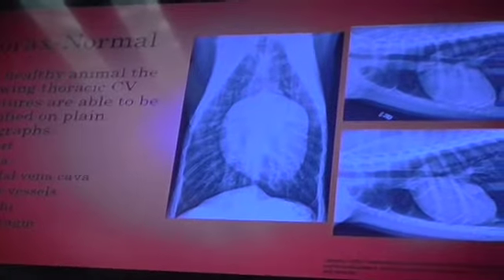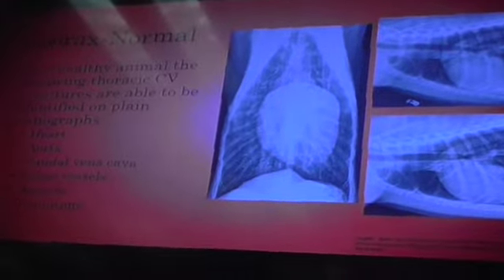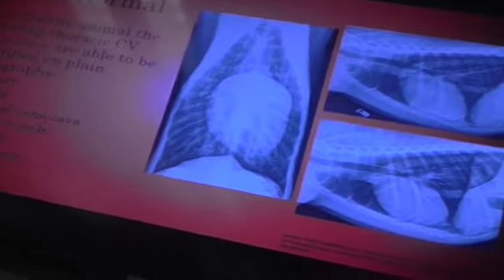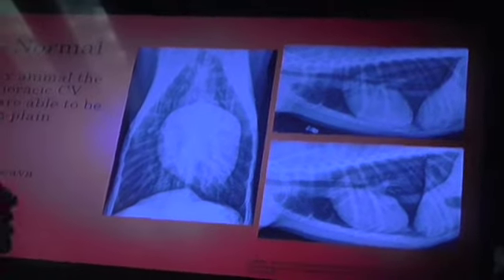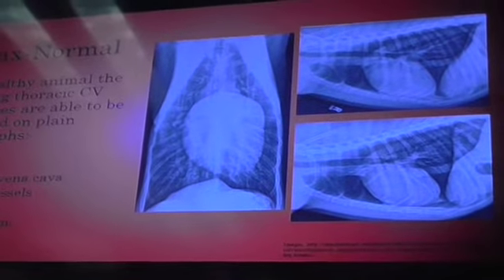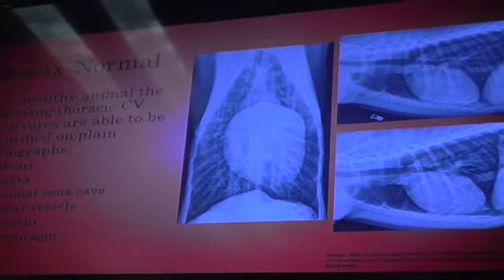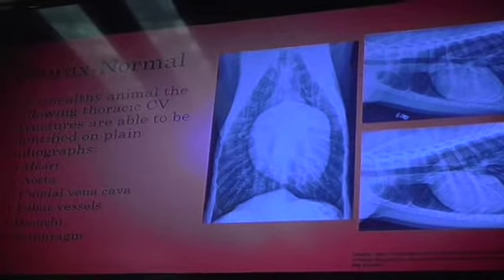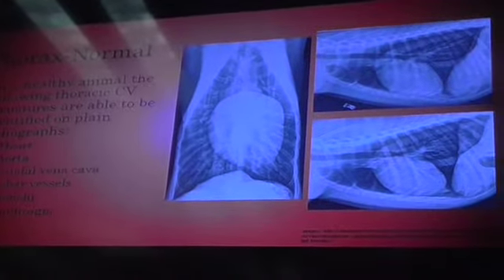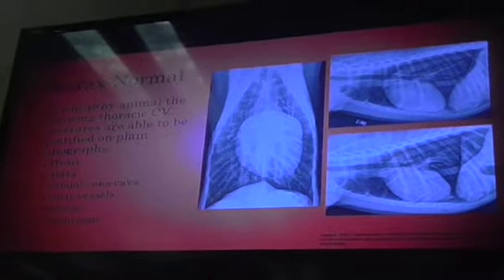This is the same slide, same information, except I took out some of the respiratory or the pulmonary structures. So I focused mostly on the cardiovascular and discussing the organs in which we can see. I left the bronchi on there only because they're important for when we're looking at the artery, bronchus, vein, and noting in which order we should see them stacked upon one another.